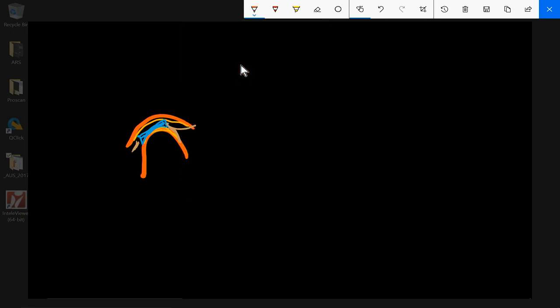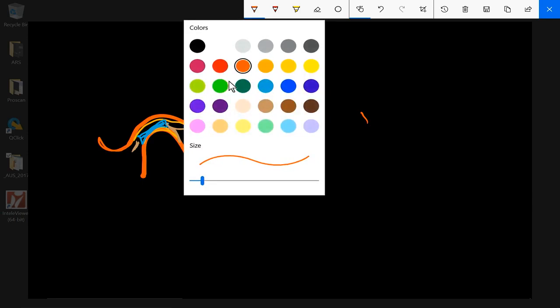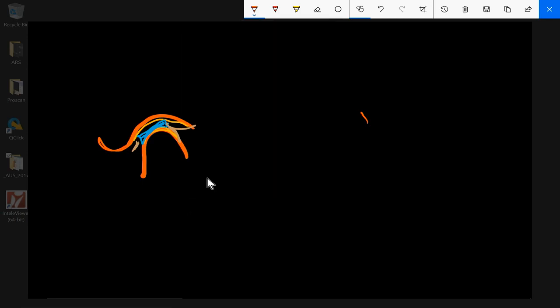Now, the temporal bone continues on down as a bump called the articular eminence. So now let's look at the open mouth position. In the open mouth position, better make it a little thicker. In the open mouth position, I have my condylar fossa, my articular eminence, and now my condyle has translated and rotated forward.